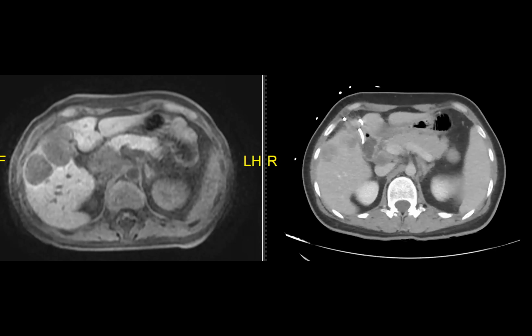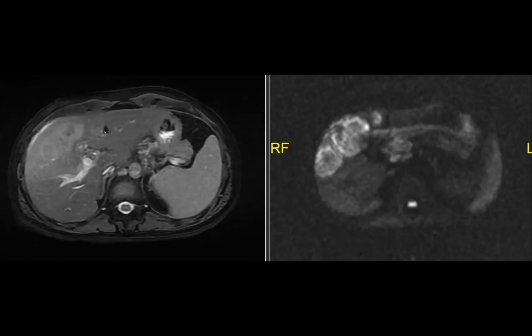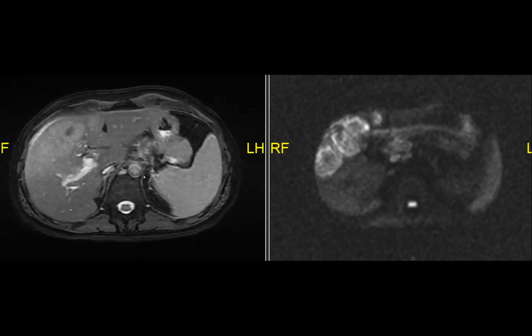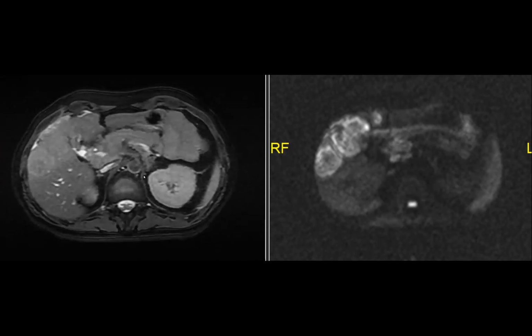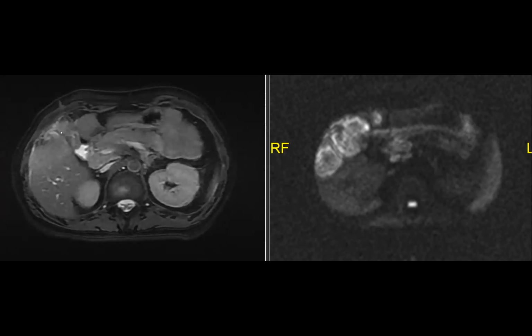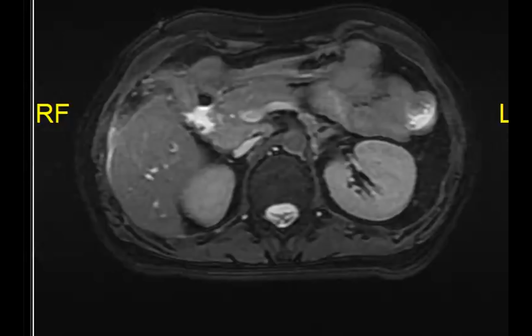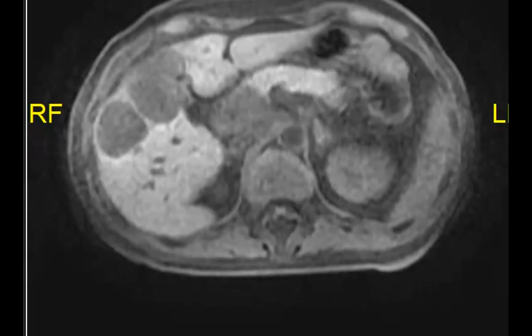And then two questions. Was his colon normal on that CT? And then why does he have splenomegaly? Oh wait, the spleen is not that bad. No, his spleen is not that bad. Yeah, he's young. I find that sometimes in young people, spleens are a little more generous. Anyway, when you look carefully on MR, you can actually see that there's this fuzzy stuff that is also like extra extension.